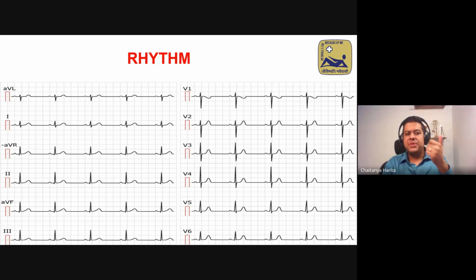In an ECG, if you look at lead 2, again, the most physiological lead, you should have SA node to AV node, P wave and PR segment, stimulation of AV node, bundle of His and ventricle, QRS segment, followed by T. Every complex in the ECG, P QRST, P QRST. It should follow that rhythm. You can't have QRS PT. You can't have QRS PP. That's an abnormal rhythm. P QRST, P QRST.